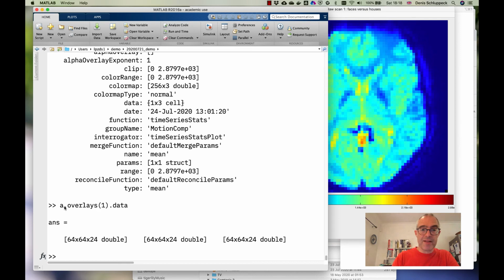So this is something that's quite commonly used if you want to do some analysis. You maybe want to rely on a previously computed analysis and access the data in there. Okay, so this is one way in which you could do that: use the analysis as a starting point. You can also get at some of those maps more directly using the view-get functions, but this is a good illustration of how this works.